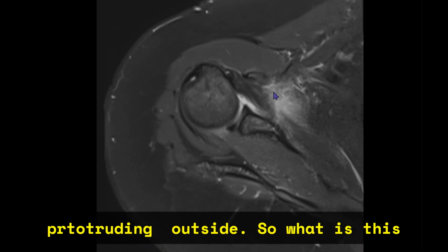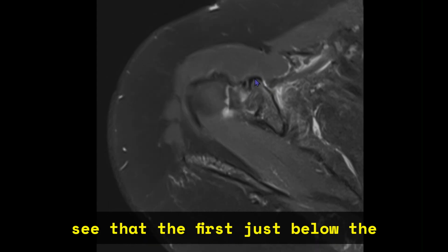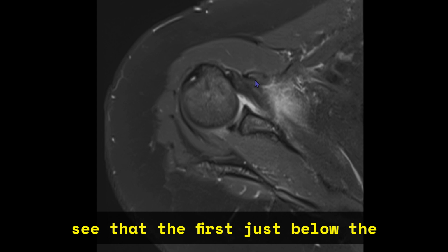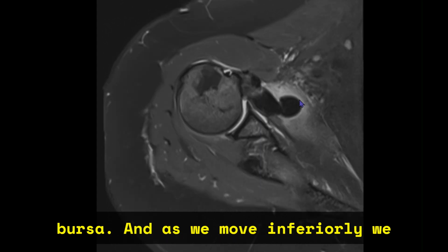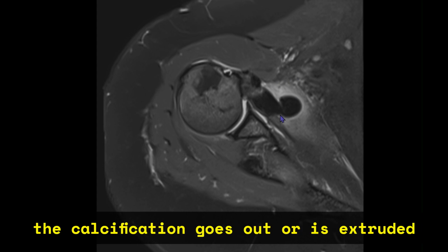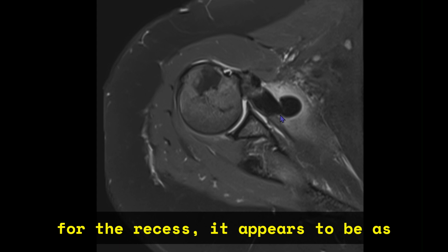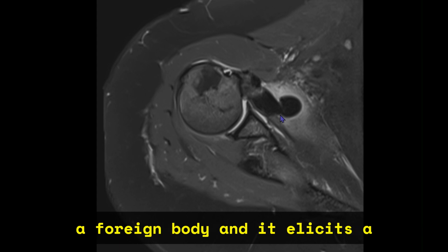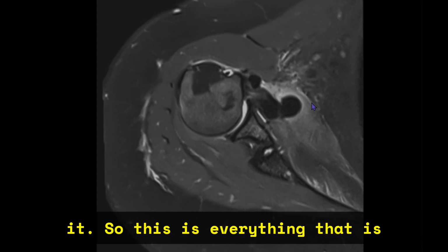So what is this space? As we move from superiorly, just below the coracoid process is the subcoracoid bursa, and as we move inferiorly we get the subscapularis recess. Whenever the calcification is extruded into this recess, it appears to be a foreign body, and it elicits a significant amount of reaction. So this is everything that is reactive.